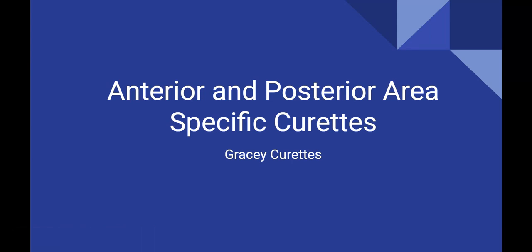Anterior and posterior area-specific curettes. Gracey Curettes.